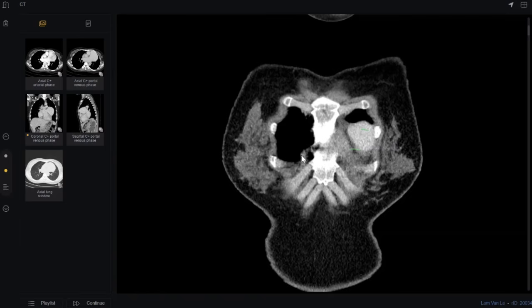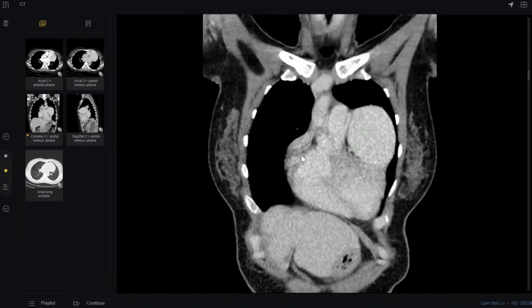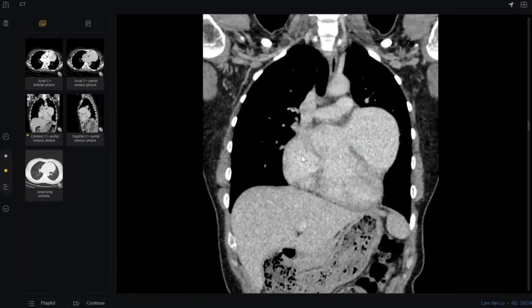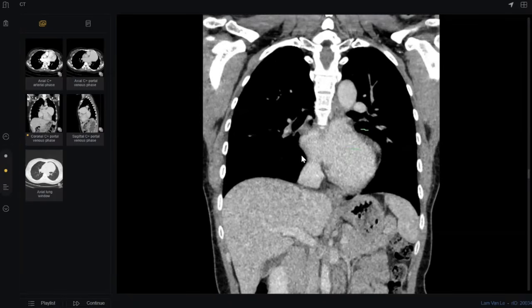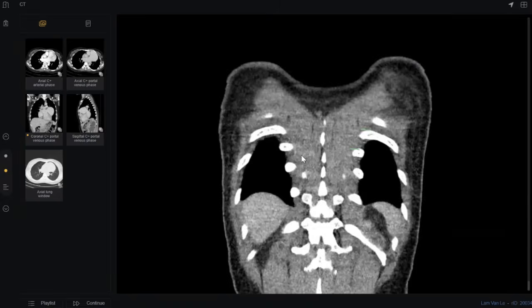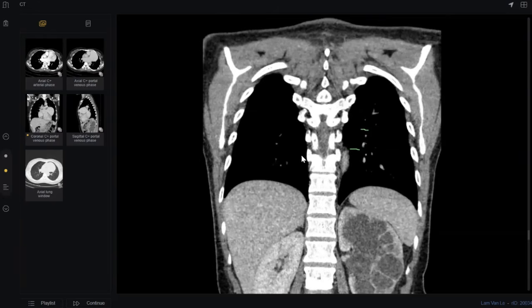What is the most important thing about this patient? The patient may develop thromboembolism. What else? The patient may have pulmonary hypertension, so I will also look at the lung window to check for the presence of a pulmonary embolism. And what about this? Yeah, here I can see that the left kidney shows a significant dilatation of the pelvicalyceal system, so this may be due to hydronephrosis.